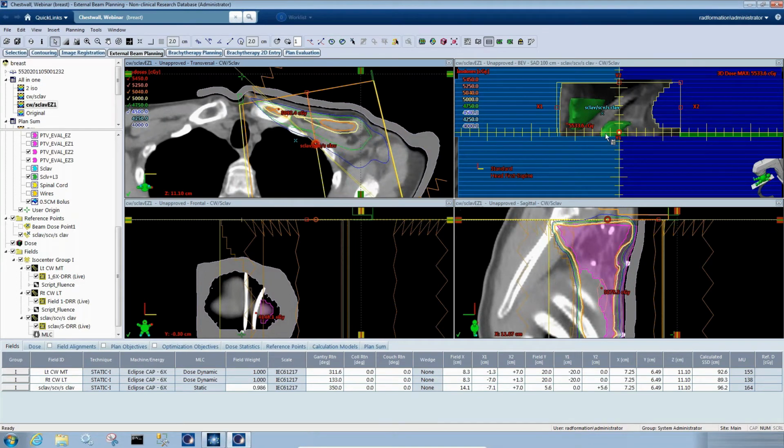So I think a lot of us maybe drop that jaw down just 1 millimeter to get that extra dose, but this is kind of that in between where I don't need that full open field. I just want 1% or 2% to show the physician, yeah, I'm still getting 99% coverage where that cold spot is, right on the match line.